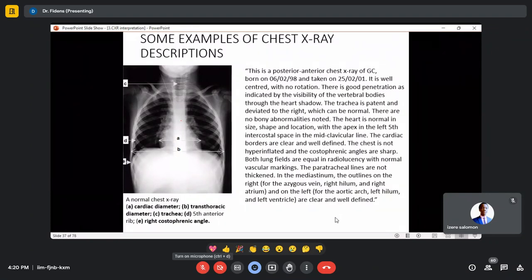In analysis, you have to see the important things, and you try to correlate it with the findings in the clinical history during interpretation. Yes, exactly. So here in this report description, they didn't talk about analysis and interpretation. For interpretation, you have to mention even the conclusion and differentials.